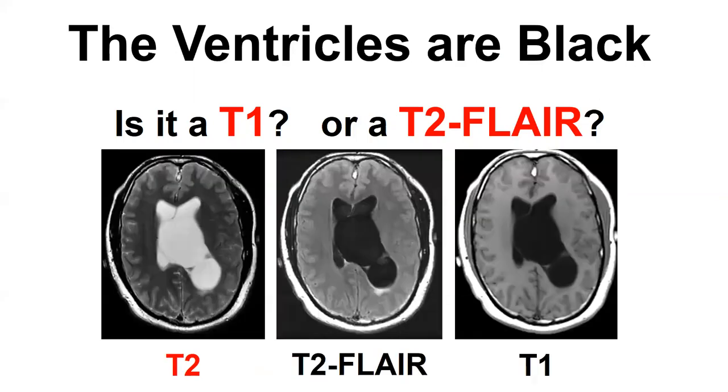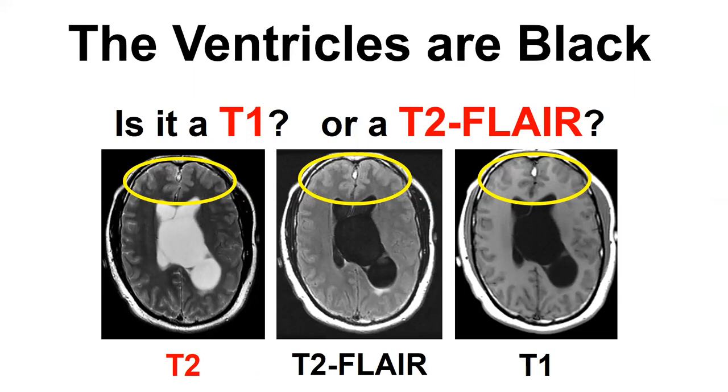All right, there's the T1 thrown in, just pure T1, just for comparison. And again, if you look at the area I've circled in yellow, white matter, hyperintense to the overlying cortical ribbon, that's the T1 in this thing. This was an intraventricular arachnoid. Let's go back just a second. This was an intraventricular arachnoid cyst. Did you know that arachnoid cysts can occur in the ventricle? Absolutely. Well, we'll just throw in a little bit of pathology then.